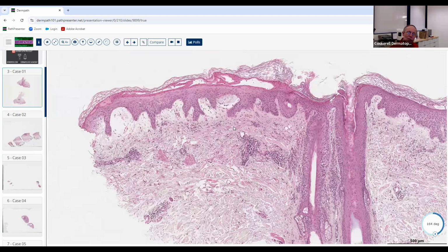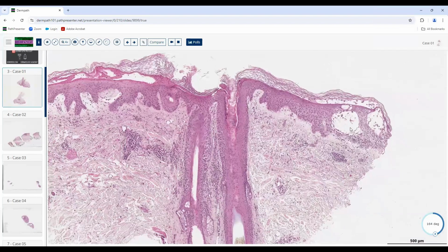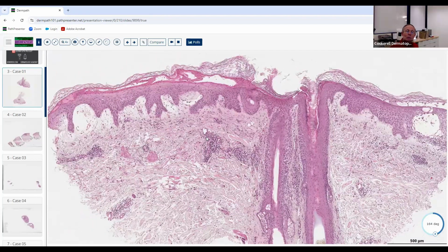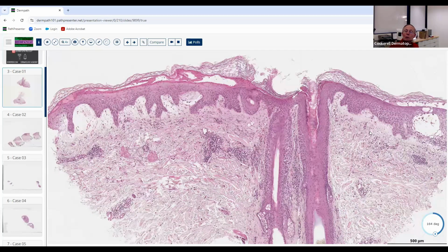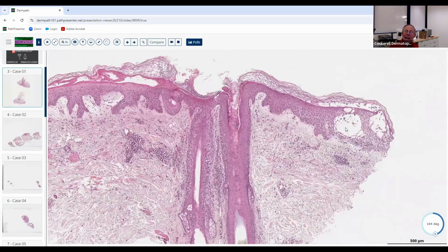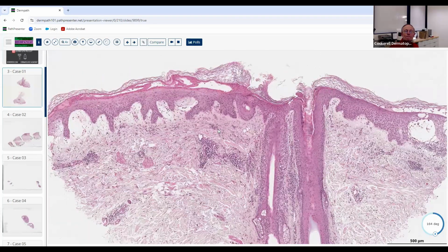And you said seborrheic dermatitis. You can get spongiosis there, but have you ever seen seb derm with papillary dermal edema and actual spongiosis? No. No, you wouldn't. But you are right, you do see spongiosis in there. You can see dyshidrotic dermatitis with that, pompholyx for example, and acute allergic contact dermatitis, which classically gives you this degree of marked spongiosis, like poison ivy, Rhus dermatitis. That would be certainly one we think about there.